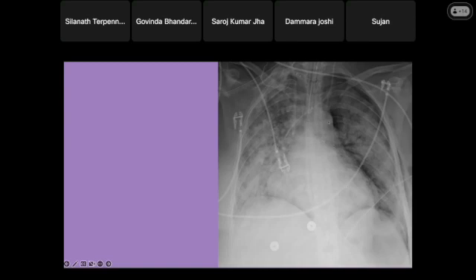Okay, what else? The patient is so sick, has the ET tube placement, has the esophageal probe here in the cervical esophagus, has the NG tube placement, has a left IJ catheter placement, right IJ catheter placement, and also has the left chest tube placement. The tip of the chest tube is in the lung bed, so they're trying to drain fluid, and then the side port is still good. There's a lot of subcutaneous emphysema here.